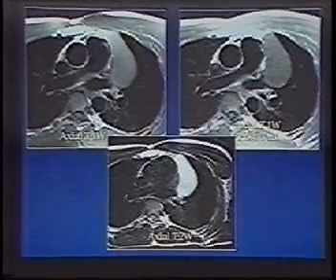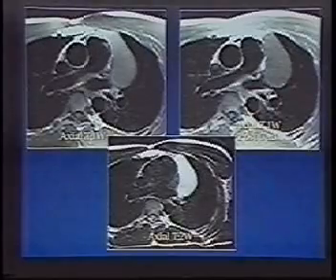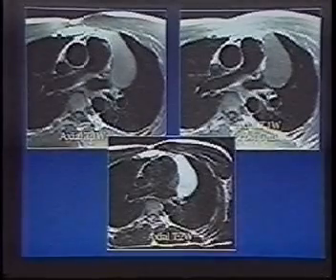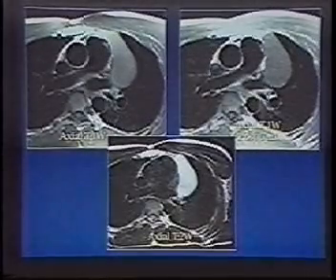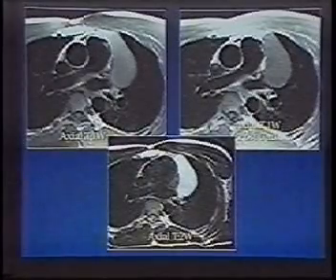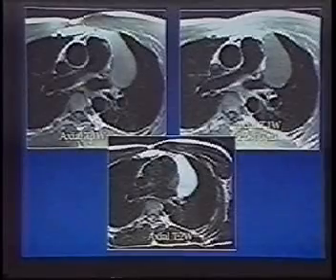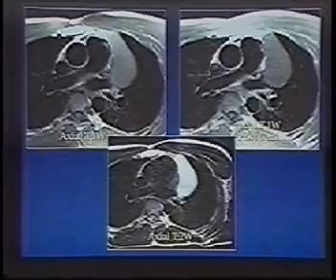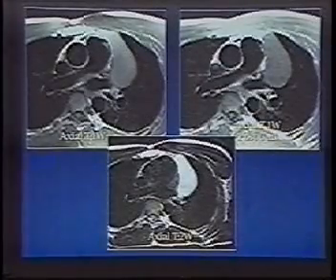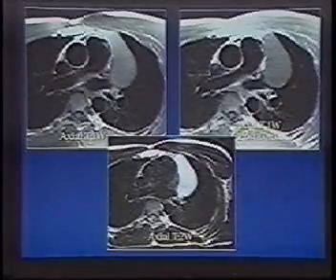So what did echo show? No blood flow in the mass. So then they sent the patient to MR. Okay, so we see the T1 weighted image here, T1 weighted with gadolinium. There's no contrast enhancement. So what pericardial or pericardiac mass will not enhance? Well, a hematoma. But there's one other mass as well. You can see on the T2 weighted images, there's high signal intensity. This is fluid. So this is a pericardial cyst. So a pericardial cyst is another type of mass that will not enhance.